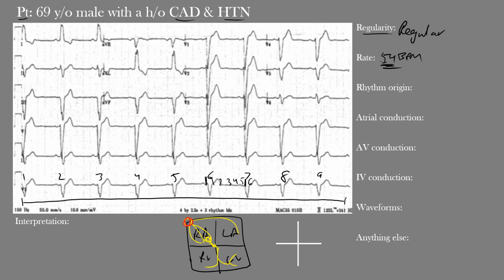And what we're going to do to tell if we have sinus origin is to look at our P waves. Now, if you imagine this is where the sinus node is and everything's heading in this direction, that would mean our electrical axis is heading this way. So if you put 0 degrees here, this would be positive 90 degrees. This is plus or minus 180 degrees, and then minus 90 degrees. That would mean the normal axis, if it's heading in that direction, would lie somewhere in this range, and it's actually between 0 and positive 75 degrees. That's our P wave. Remember, with the P wave, we're looking at things above in the atria. The P wave represents atrial depolarization.